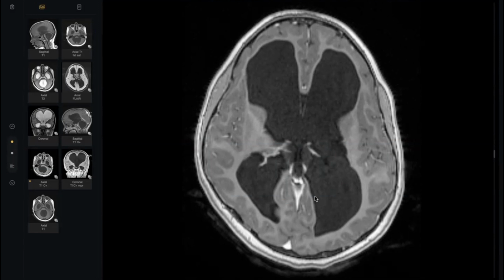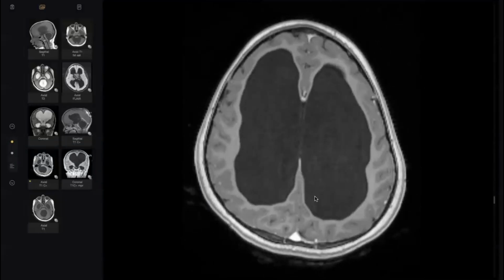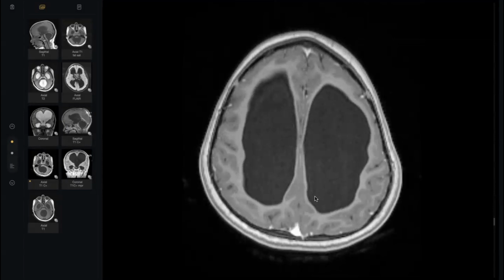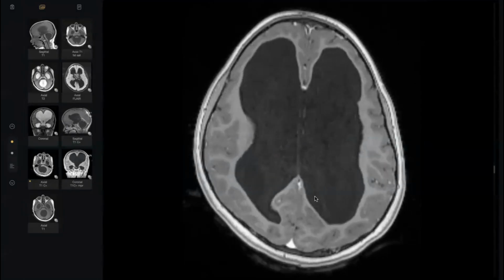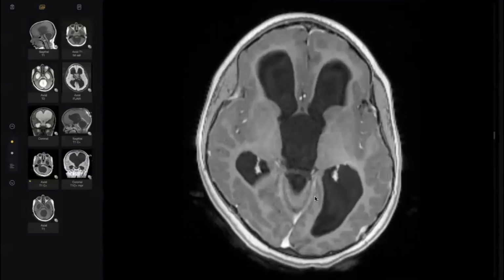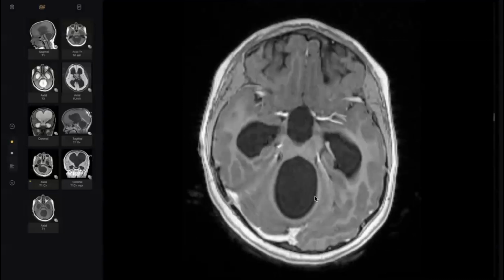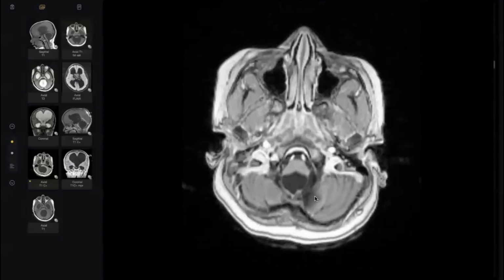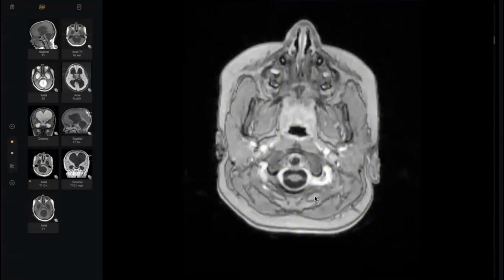In your opinion, could you tell me the possible cause here? So it's a communicating hydrocephalus, but no definite obstructing lesion is appreciated. Okay, but what is the expected cause here? What is the cause of this obstruction? We didn't find a mass, we didn't find any obvious pathology till now. Give me a possible cause.